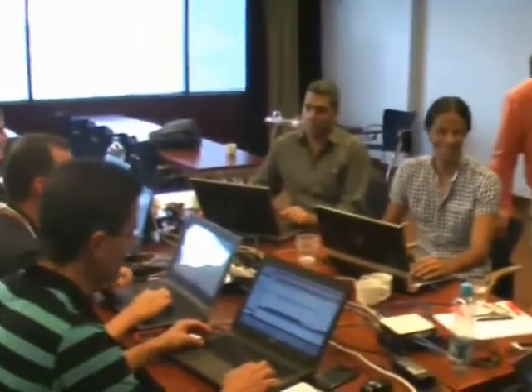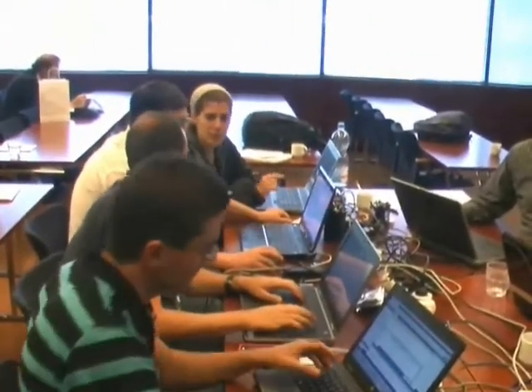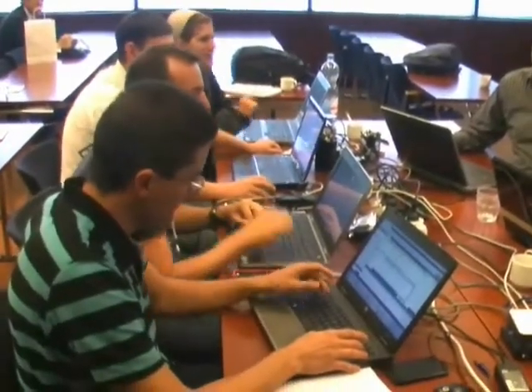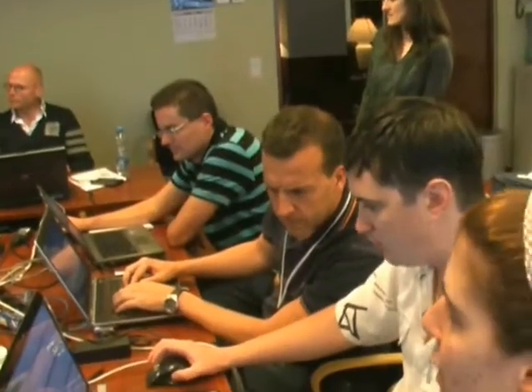Okay. Which is the patient ID? Okay, 3233. 3-2-3-3. 3233. This is error prone. Okay, let's see what will happen. Starting from the first one.